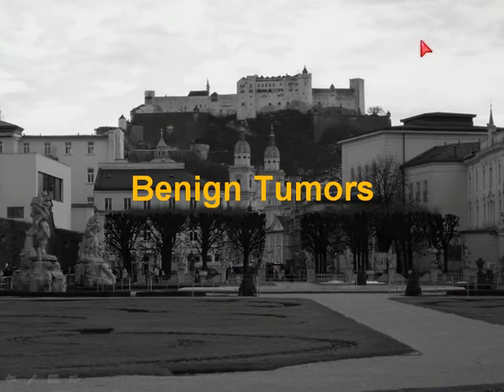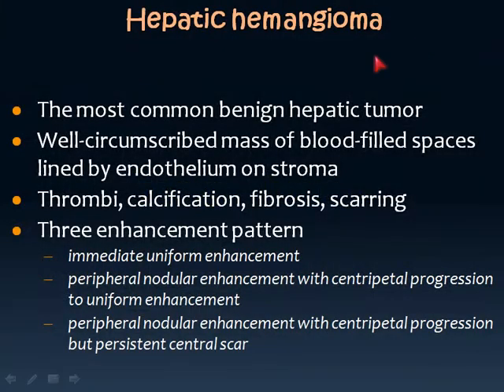Moving to the third group, benign tumors. Hepatic hemangioma is the most common benign hepatic tumor, and it is a well-circumscribed mass of blood-filled spaces lined by endothelium. Thrombosis, calcification, fibrosis, and scarring may occur. Three enhancement characteristics have been established.